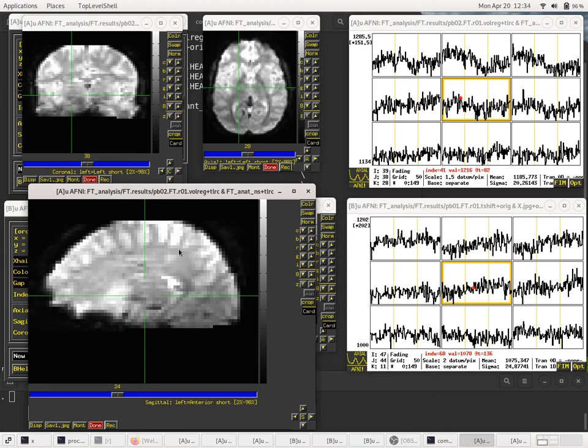That would take infinite resolution data, or at least resolution that's basically what would be sufficient to call full resolution relative to the anatomical fluctuations, the variance in how the magnitudes change over space. Anyway, so we can't fix it. That head motion will forever corrupt our data, and that's why we tend to want to censor volumes that have high motion. But still, we can tell that even across at this time point, it looks like it's registered.